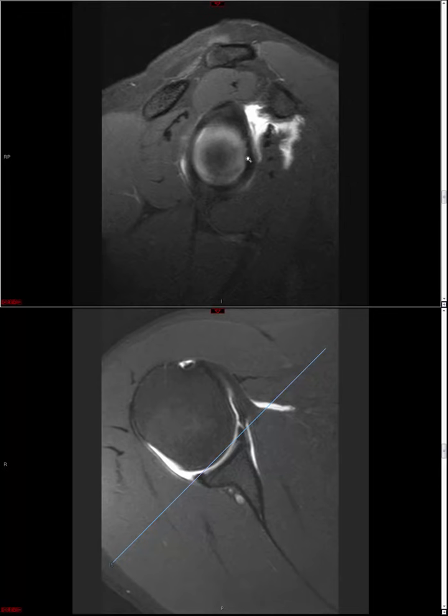And so because there's this difference in how people use a clock, I tend to be deliberately redundant in my interpretation. So let's say I saw a labral tear right here. Then I would say that there's a focal tear of the posterior superior labrum at the 10 o'clock position. So I've denoted the location in one way, and then at the 10 o'clock position. For those who use the same clock as I do, then we are in concordance. If someone happens to use the other clock, they might think I'm using the wrong clock, but they'll essentially know where I'm talking about in the labrum, so the communication of information is not interrupted.